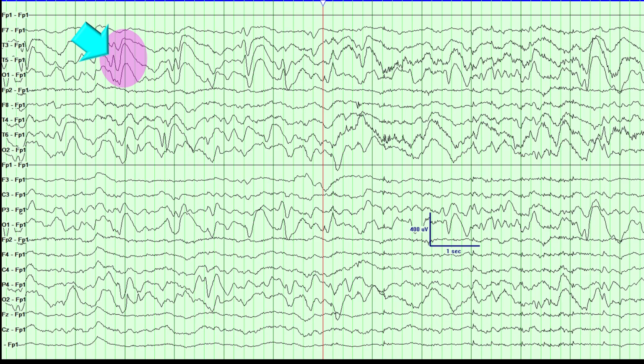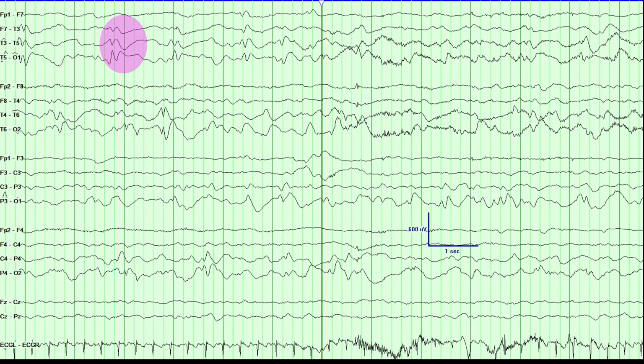This second potential is of a brief duration and it has a restricted area of distribution, a high voltage gradient, and little coherence among the electrodes. Now, using a bipolar montage, the previously well-seen long-duration widespread potentials with a small voltage gradient and high coherence are almost gone, and the preceding potentials can be well appreciated.